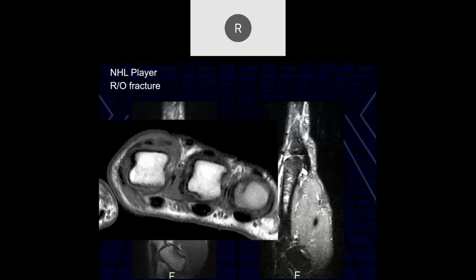And then here are the axial images. You can see the non-symptomatic digits over here and compare them to the symptomatic digit. What do you think? So the extensor tendon I think is intact, but there's a lot of soft tissue edema along that. Yeah, I guess it's the ulnar aspect, so the ulnar sagittal band looks like it's injured. Over here.